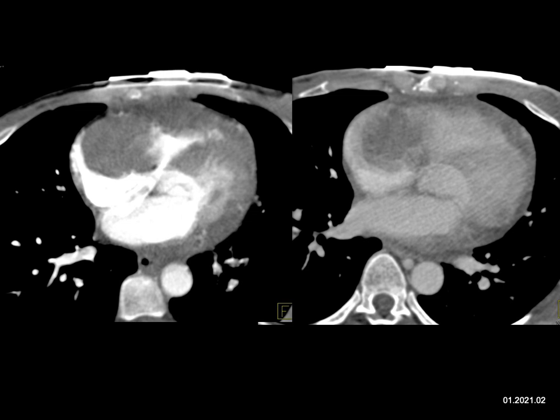So really the question is, is this a tumor from the lumen like a myxoma? Not a great location for myxoma. Or is it something arising from the wall of the heart or maybe even the pericardium and then growing into the heart? Things that occur by the right ventricle or right atrium are things like angiosarcomas, for example. So let's look at the choices.